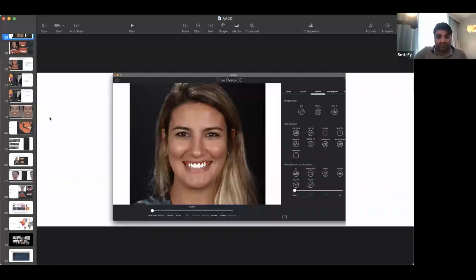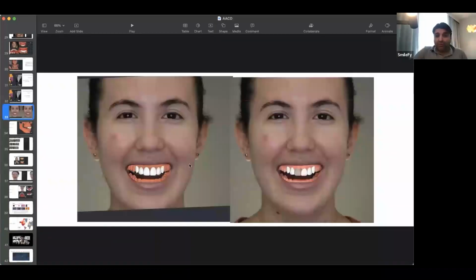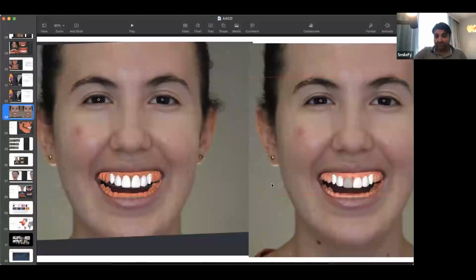Let me check. Here is a beautiful example that I want to show you. The visual communication is so important. We do have 2 designs like this. That's design number 1, that's design number 2.